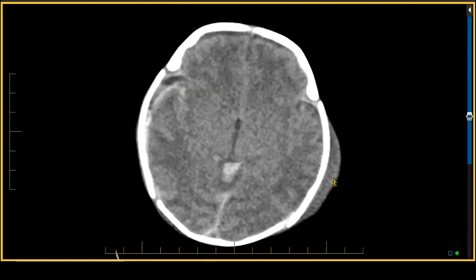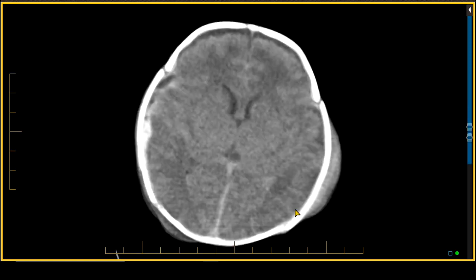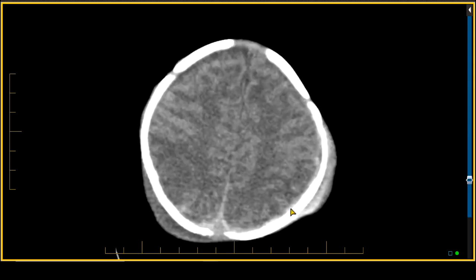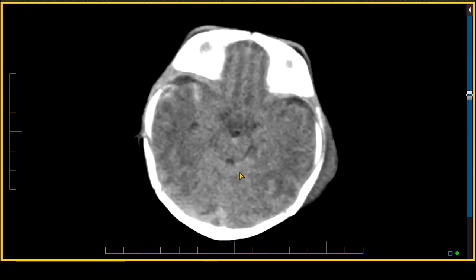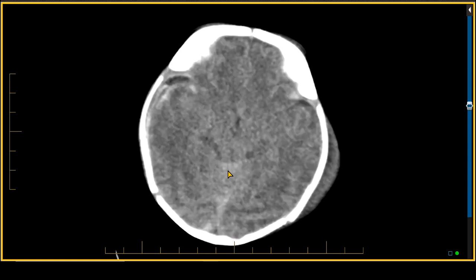The patient continues to show the soft tissue swelling and continues to show a small amount of subarachnoid blood and extraaxial collection under the fracture site. There is more blood product which is seen at the tentorial incisura, that is the top of the tentorium along the superior vermis.